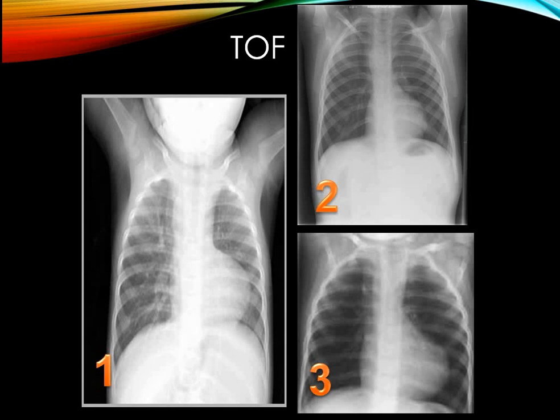I mention this note because a number of students in the exam may get a chest X-ray like this number 3 and state that this is emphysema because the lungs appear hypertranslucent, which is not. In fact, it's lung oligemia and associated with the cardiomegaly and boot-shaped heart.